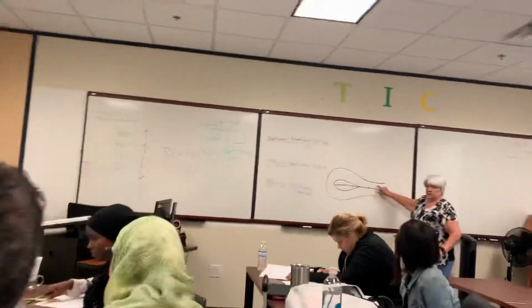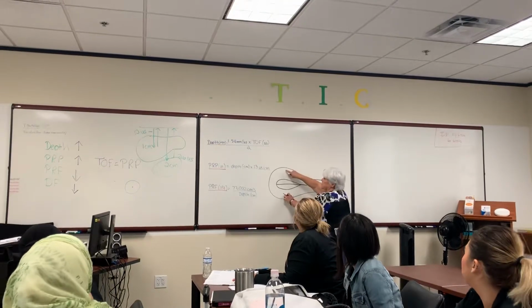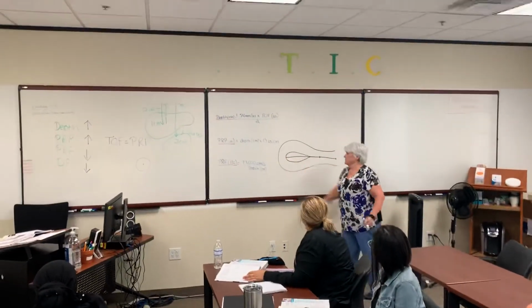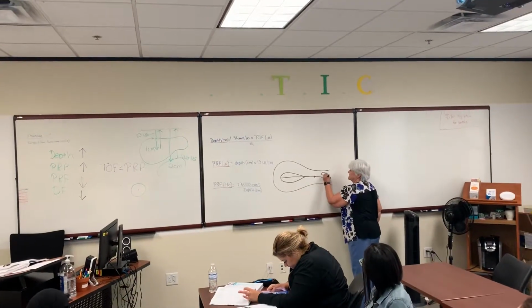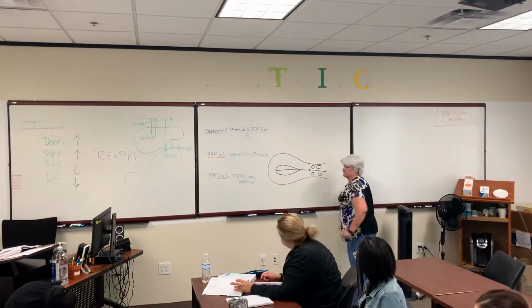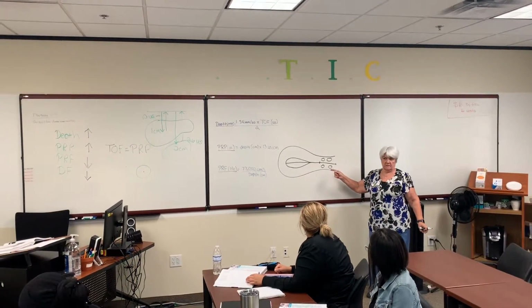This is the cervix, this is the lower uterine segment, this is the corpus or the body, this is the fundus. You're going to see Nabothean cysts in the meat of the cervix, okay?